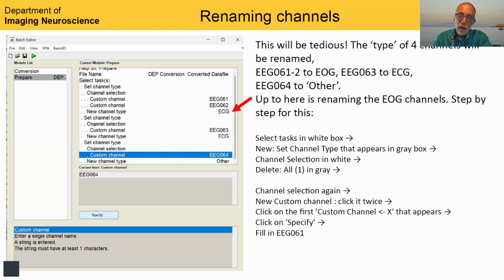And we're going to scroll down and delete the all option, exactly as we did in the previous slide. So if you miss the mechanics of this, you can always use the previous slide to see how it's done.